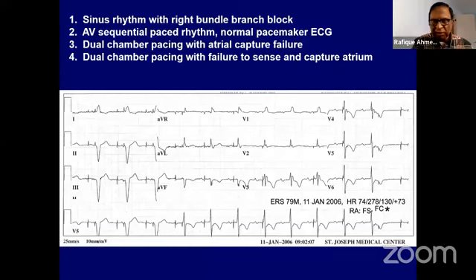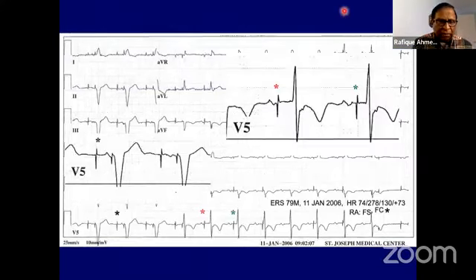So this is better. I think both C and D, C is partially correct. I'm going to enlarge this ECG. Look at this. If you look at this one, I don't think there is any capture, but over here is different. There is a P wave. So it's intermittent capturing in the atrium, number one. This one did not capture, this one did capture.